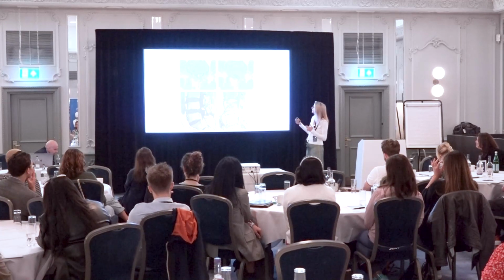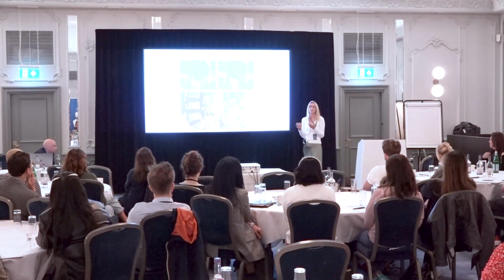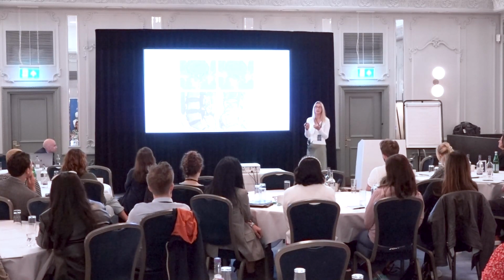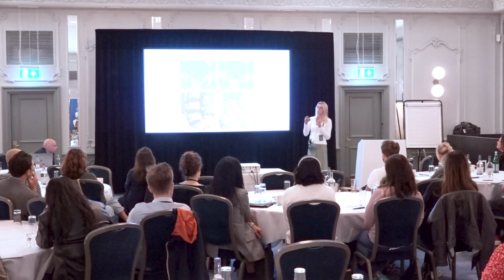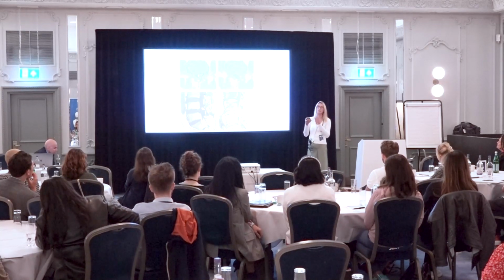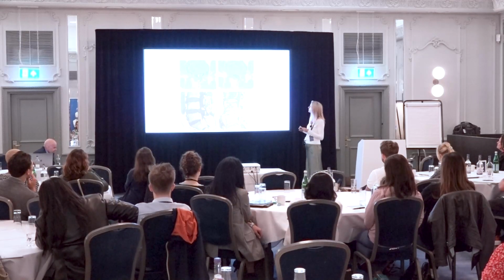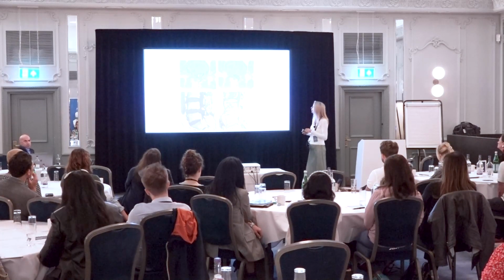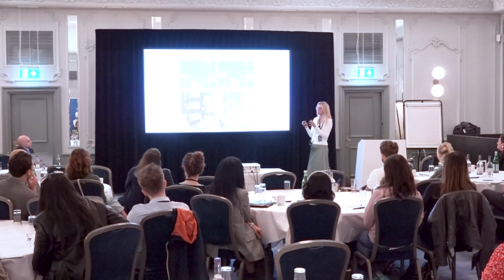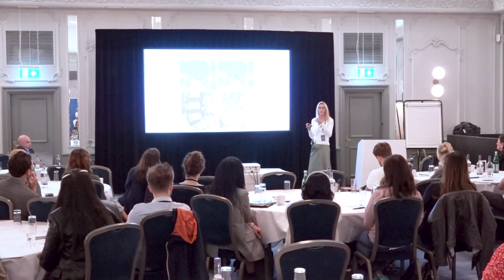Now, what we see in the acute phase is you get edematous tissue at the site of the discectomy and around the side of the theca. And what you've got to work out is, is that scar or is that recurrent disc? And the way to do it is we give contrast, and what happens is with contrast, if it's scar, it tends to enhance uniformly through the area.